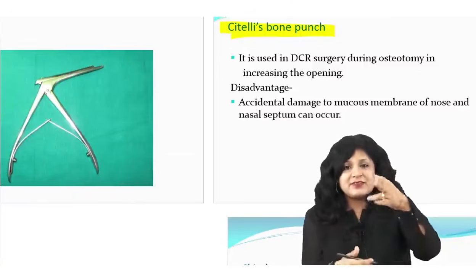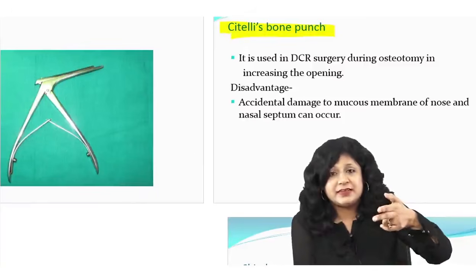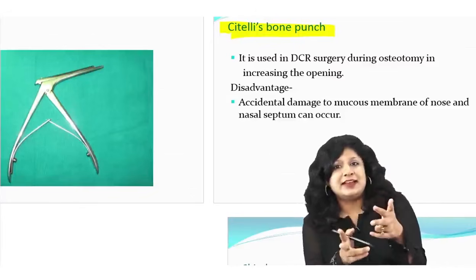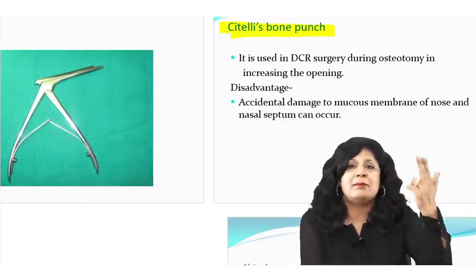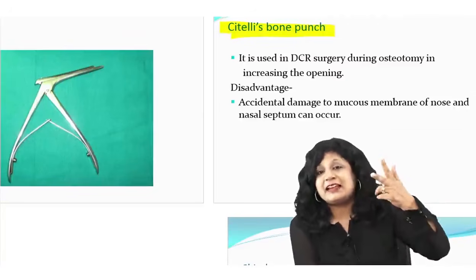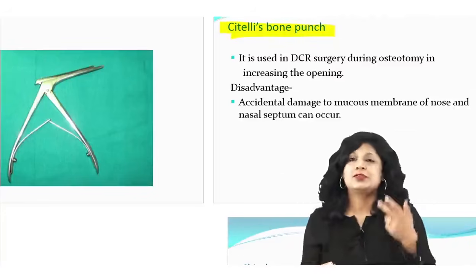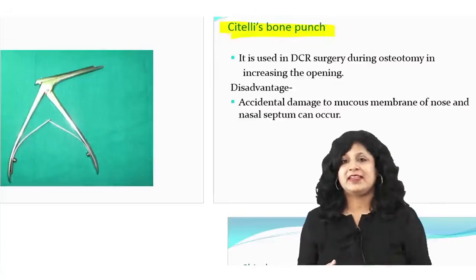So that is done with the help of this bone punch, and I have seen the consultants doing this. The moment you use the bone punch, you get a crackling sound that makes you remember the carpenter's noise. That similar kind of crackling noise comes when you do that bone punch, and a large amount of energy is also required, because you know it's hard to do the bone punch and create an opening there.